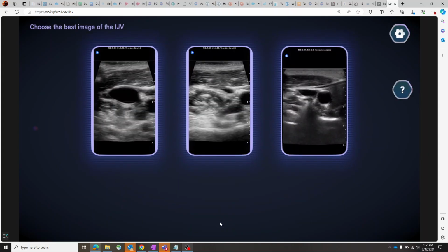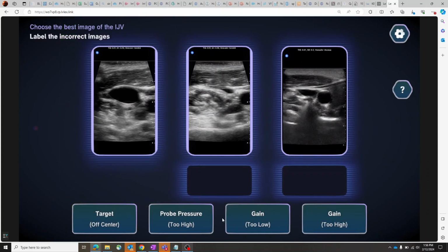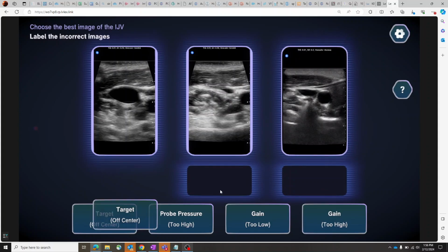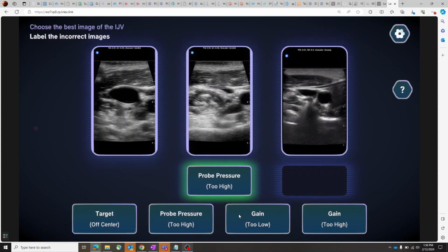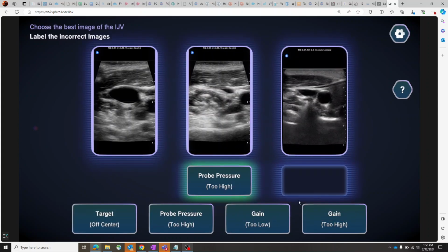Then what we did is we built that calibration phantom in engine, and we cast our physics simulator over it as well. So that allowed us to compare what the image generated by an actual ultrasound looks like compared to our control calibration phantom in our engine. And that allowed us to finely tune how the intensity of the pixels that are being returned by the simulator matches what an actual ultrasound would do.